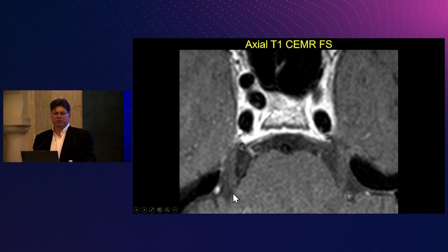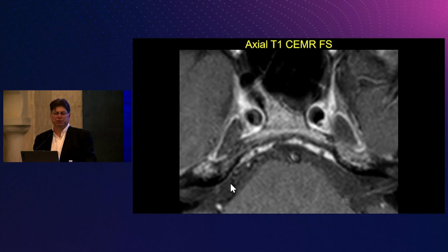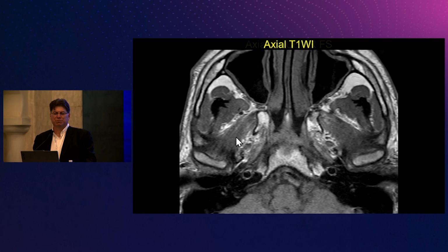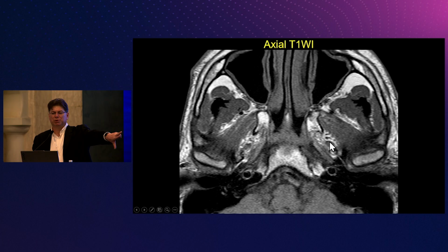Those fibers should not enhance. We usually don't see enhancement of the cisternal segment of any of those cranial nerves. We don't see enhancement of the trigeminal cistern or Meckel's cave. And then extracranial head and neck, this is V3 below ovale. So if I find my condylar head at the TMJ and I go a centimeter medial and a centimeter anterior, that's how I find V3 under ovale at that level.